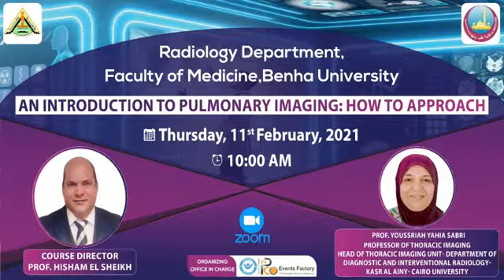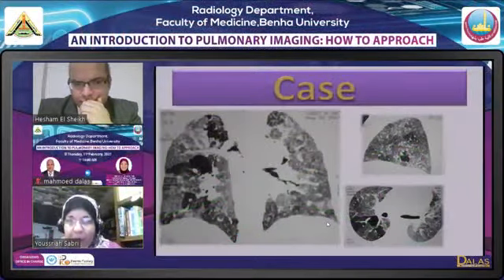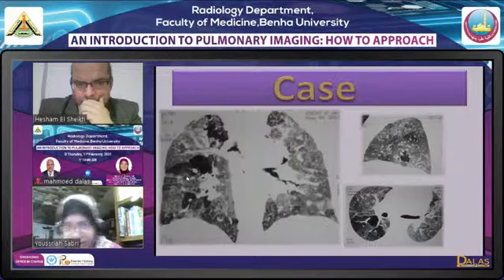فالمنظر اللي قدامنا ده حضرتك، انا عندي bilateral diffuse ground glass with intervening lucences ما فيهاش vessels، وintervening lucences بتعريفه فيها شويه normal lung marking. again هذا الديفيوز appearance ده مش منظر من مناظر الكوفيد خالص. الكوفيد بيبقى باتشي جراوند جلاس، مش الجراوند جلاس هو اللي ملك الدنيا وانترفيننج موزايك برفيوجن. مفيش موزايك برفيوجن في الكوفيد اصلا.